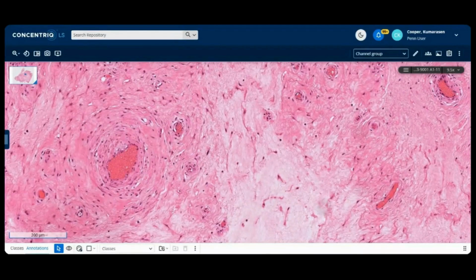Let's see, what are people thinking? All right, so we have epithelioid angiomyolipoma. Angiomyolipoma, as you know, I think you want to say epithelioid angiomyolipoma. That's referring to the morphology of large pink cells, and angiomyolipoma would belong to the PEComa group. So for that, you'd want the PEComa markers.